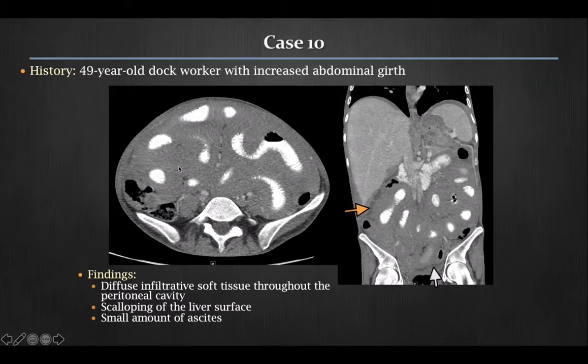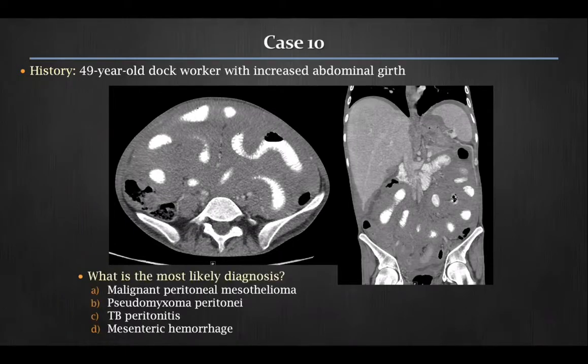Without being able to put a region of interest on here, I can't prove it to you, but if you see something like this, be sure to check whether you're dealing with fluid or soft tissue, because obviously it changes dramatically what the differential would be. And there are also no enlarged lymph nodes, another pertinent negative here. So question, what is the most likely diagnosis?